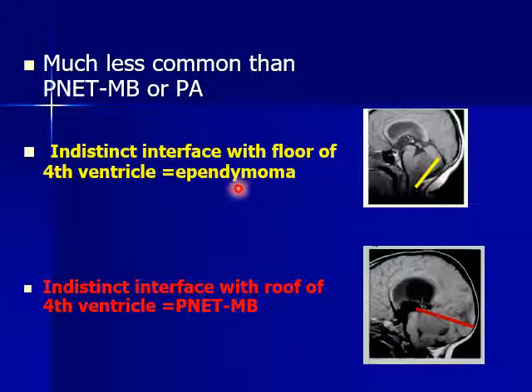Usually you are asked to differentiate medulloblastoma from ependymoma in the fourth ventricle. Okay, we have certain criteria that we use to make this differentiation. Number one, ependymoma is much less common than medulloblastoma, statistically wise. Number two, it is indistinct from the floor of the fourth ventricle.